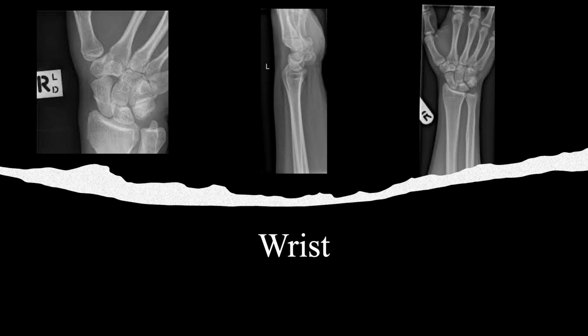Then you want to look at the scaphoid specifically for any fractures. It has a higher risk for avascular necrosis and is very difficult to spot the fractures, so you want to keep an eye on that and really look at that. And then for pediatrics, you also want to really inspect the radial cortex for any angulation or bulging. You can get that a lot in pediatrics, and you want to just be aware of it.